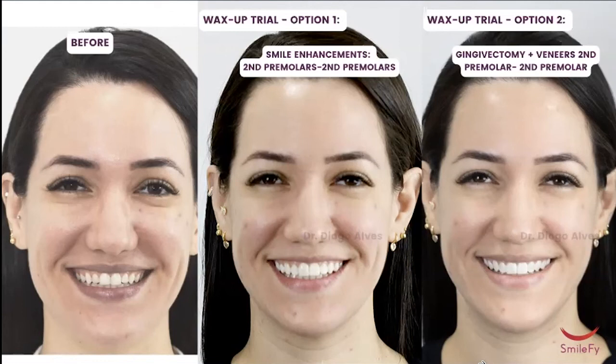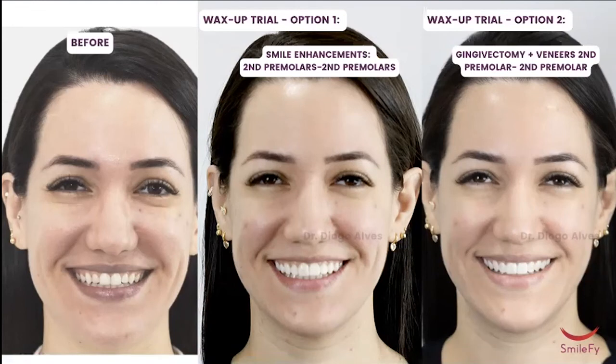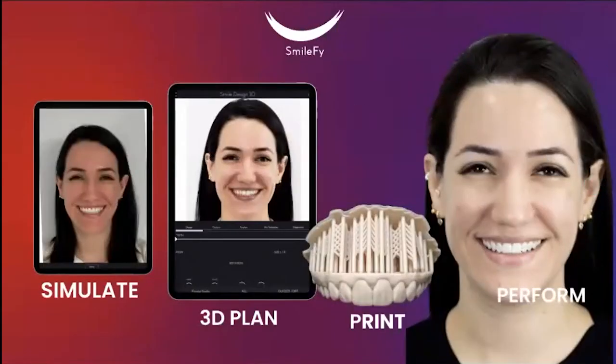The main message here is to show you that if you spend a couple of minutes creating your own dental wax-ups, treatment planning yourself, you will be able to sell much more complete cases to your patients without having to force the patients to do anything. Here, you will be able to create a whole new workflow for a patient where you involve the patient from that first consultation up until the beginning of the procedure, giving them the chance to get involved and knowing from the beginning how their final restorations will look.